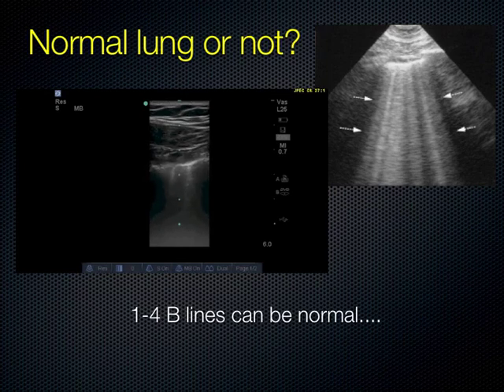That is fluid that has overtaken the air in the lung. And you remember that histology picture we just showed you with the thickened interlobular septi and the fluid in the alveoli. It could also, that fluid is next to the air in the lung and will create a reverberation, but the reverberation in that case is vertical. And I'll explain why in just a moment.